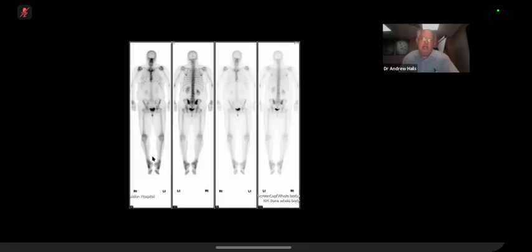The other point I point out to you is that the bone scan doesn't only show the bones, it also shows the kidneys. And I would advise in everyday life, any person looking at bone scans looks at the kidneys. Has the patient got 2 kidneys? Is there obvious hydronephrosis or whatever? As I said, this is normal. And the sacroiliac joints are normally of high intensity like that. And obviously that's the bladder.